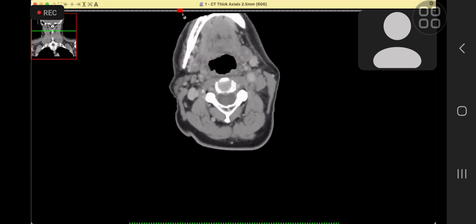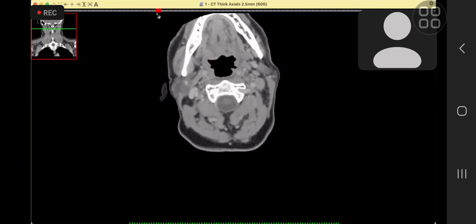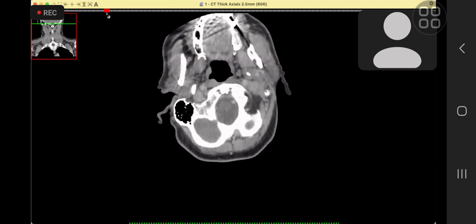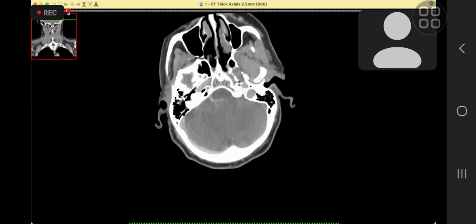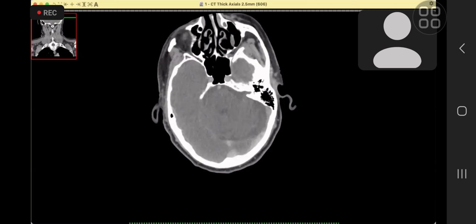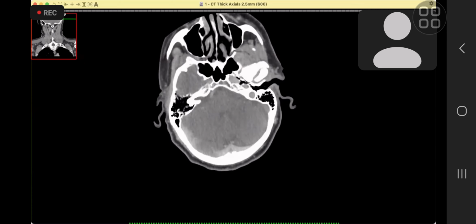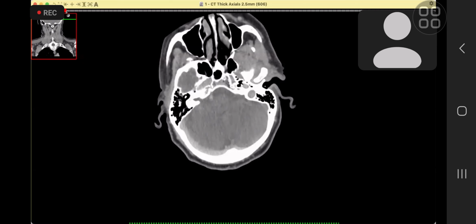I want to trace it further ahead through the skull base, as well as into the intracranial compartments. I'm looking for any evidence of transverse or sigmoid dural venous sinus thrombosis, or any extension of this inflammatory change into the brain, but I cannot find any.